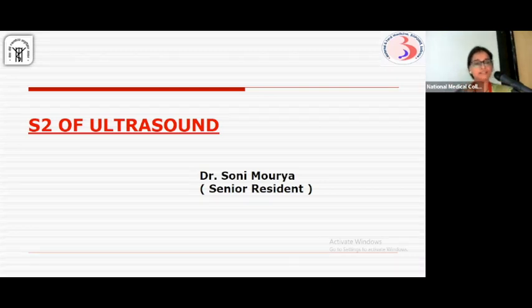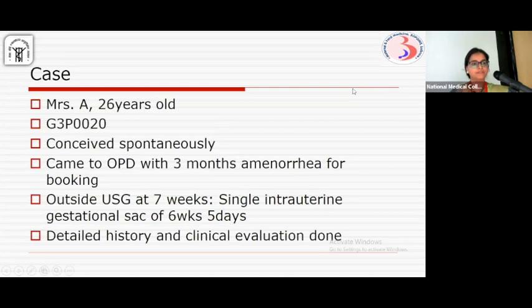I'm here to present the S2 of ultrasound. My first case is on the role of ultrasound in detection of multi-gestation pregnancy.